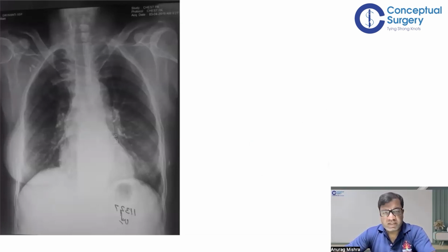But now I have to describe it for myself, or maybe I'll have to present it in an exam, or I have to write the findings or the report of it, whatever the task. So it is not like I'll just start saying, okay, this is an X-ray chest showing a normal study. I think it's always good to approach it in the same way as we do for examining a patient and then presenting the findings.